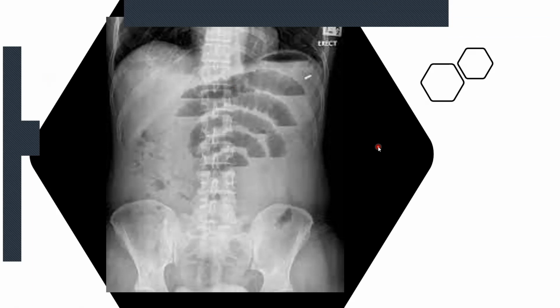Now, for most of you, this may seem like a relatively simple diagnosis, and it is a relatively simple diagnosis. The doctor, on the other hand, at the local hospital was just a bit worried as to whether it met certain criteria or not. So the first thing that we notice in this X-ray, of course, you can see the gastric bubble, but we can see the dilated loops of bowel that are over here. And it's a lovely X-ray because it's actually quite concentric and things like that.